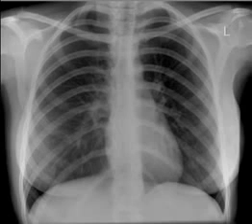Vessels are bigger near the hilum and are getting smaller and smaller towards the periphery. So the vessels are bigger here and they're getting smaller and smaller towards the periphery. Lower lobe vessels are bigger in diameter as compared to upper lobe vessels here. Left and right main bronchi. Let me show it to you once again.